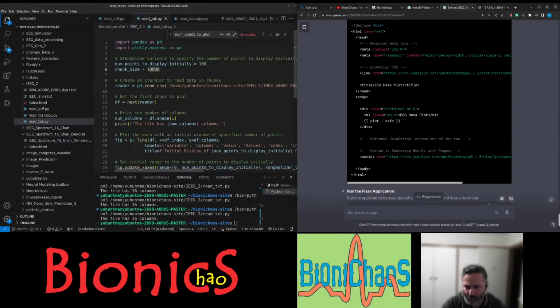Yeah, that's actually great. We might as well go for this. What's this bootstrap?